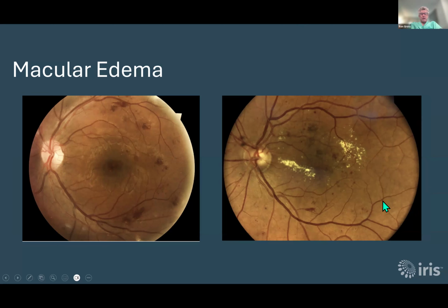If you look at the optic nerve, which is that kind of white disc, you'll see that it's kind of round, and in the middle of it there's a little white circle, and then around the white circle there's kind of pinkish. It's supposed to be pink. Take my word for it. But the pink is actually the nerve tissue that's leaving the retina and heading back to the brain. The white area is called the cup, and that's kind of the leftover space because some people's openings for the optic nerve are bigger and some are smaller, so there's always a little bit of leftover space.